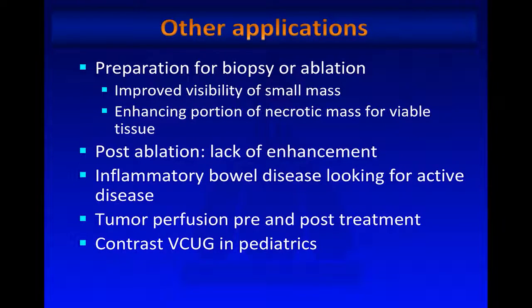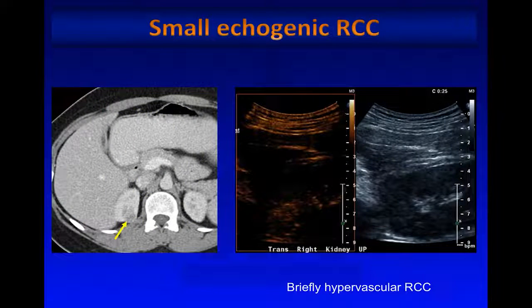It has been used also for looking at inflammatory bowel disease, to look for active disease. Also, there's some more in clinical trials for tumor perfusion pre and post treatment. And also, this is not something I'm going to discuss, but it's a very good VCUG technique in pediatrics, which is progressively replacing the regular VCUG, because of course there is no radiation in this patient, which is a huge advantage in pediatrics.